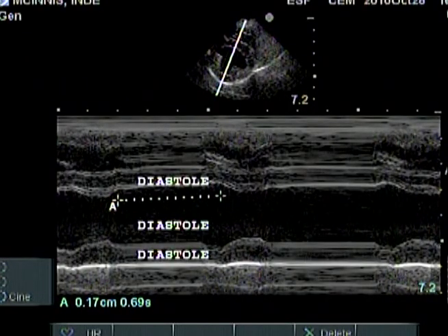With relatively slow heart rates, it is possible to see a small increase in left ventricular size just before the heart contracts. This point represents left atrial contraction, when the last 25% of blood volume is added to the left ventricle.